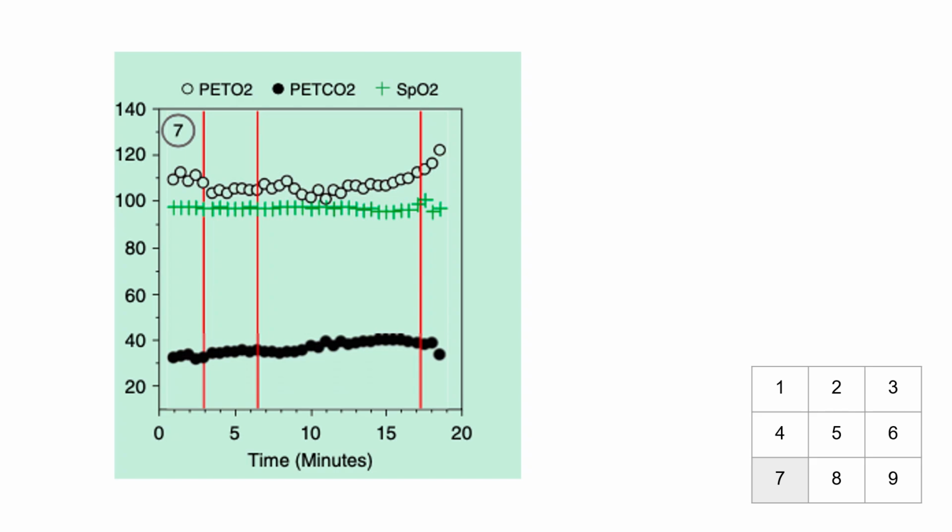A last option for determining the anaerobic threshold is to look at panel 7, looking at the end-tidal gas pressures, specifically looking for the point where the end-tidal O2 starts to rise without a corresponding drop in end-tidal CO2. This helps us identify the anaerobic threshold.